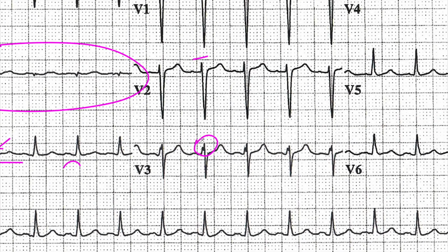Now this is interesting. We have a fragmented QRS. For those of you seeing this for the first time, oftentimes you'll see this label, small f and then capital QRS. It stands for fragmented QRS. If indeed I had fragmented QRS, something very strange, so not your typical right bundle branch block or left bundle branch block, but something more odd. For example, something like this. Just an odd, bizarre looking QRS that seems to be kind of cut up. That is a fragmented QRS.